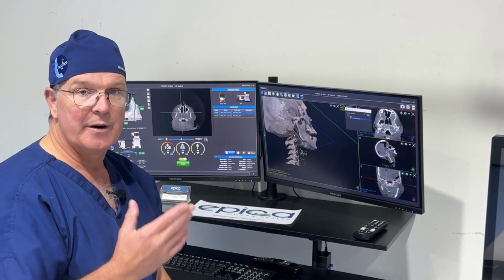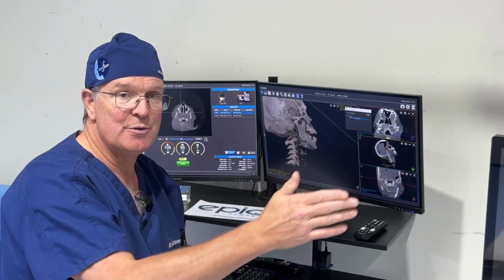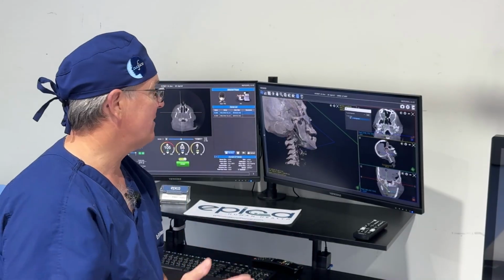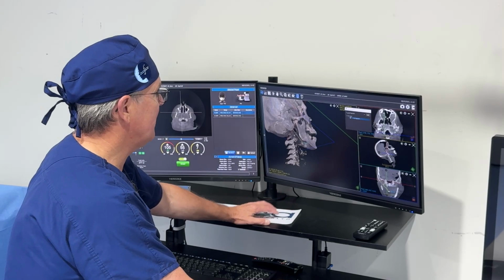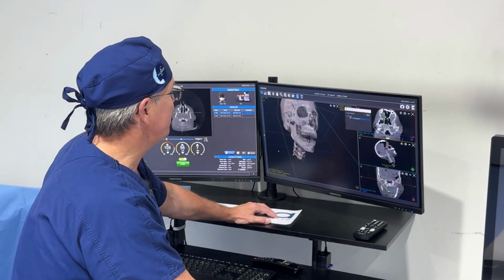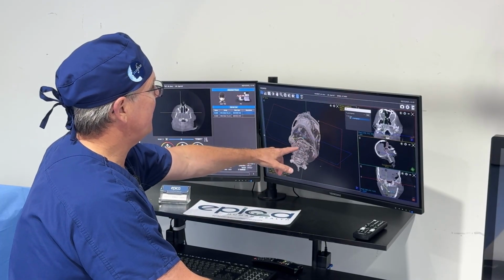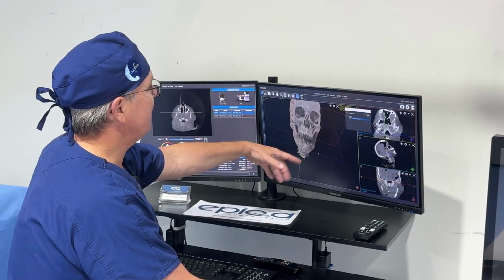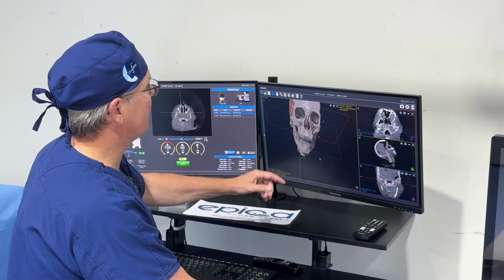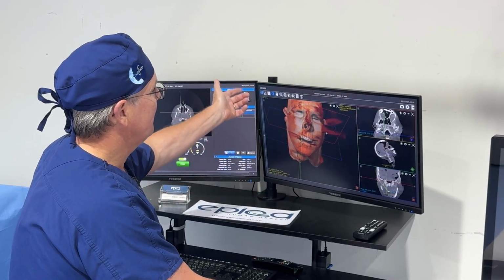And so if we're manipulating that hyoid bone, we can then do CT scans on it to show how much that has been mobilized. It's just incredible technology. And just the ability to do all these different angles that you can look at. This is just so great for teaching, to be able to say, okay, you can look up in here. And then if you want to point out what's going on with the soft tissue, you bring the soft tissue right back in, and there you are.